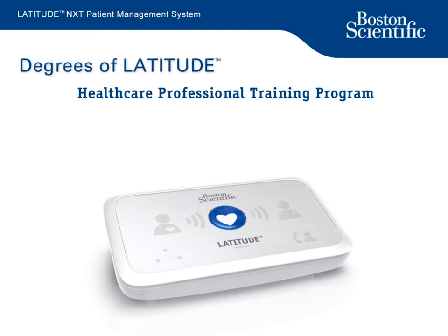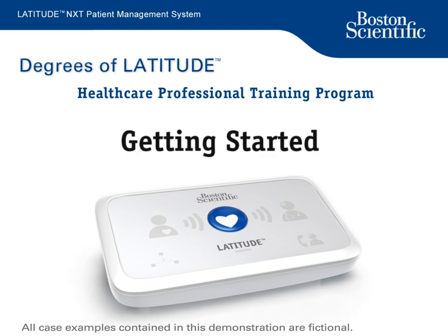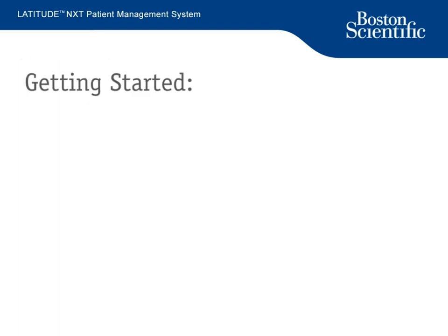The Latitude NXT website offers you flexibility and control over how you receive, review, and manage Boston Scientific device and patient data. In this training module, you will learn how to get your clinic started with Latitude NXT. There are 6 key steps to getting started on Latitude NXT.